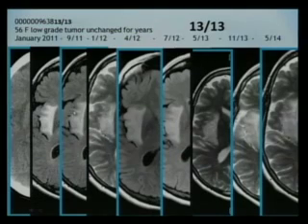And then she keeps coming back for a checkup in 2012, 2013, and 2014. And there is really very little change. And that is the hallmark of a low-grade tumor. Now, not all of them behave like this, okay?